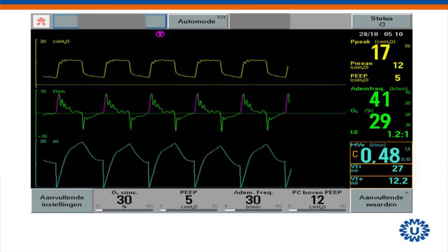What's this? I heard somebody say leakage. I don't know who said leakage. Yeah, there could be some leakage or something in the tracheal tube. But why is it leakage?